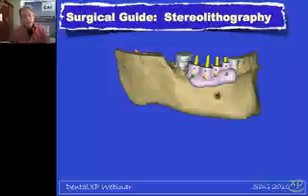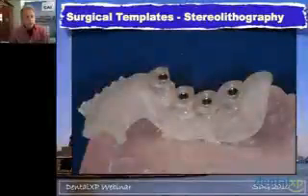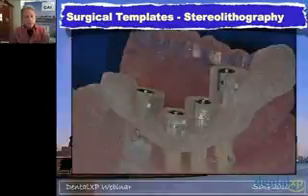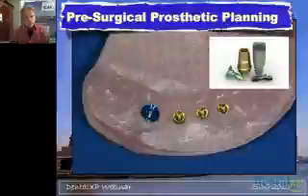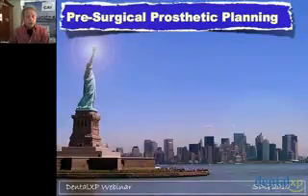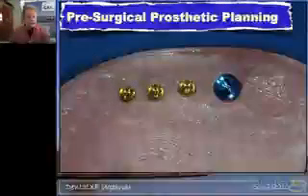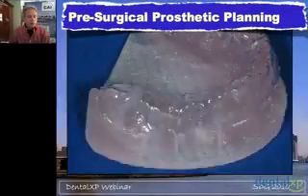And so having this capability allows us to then port out this information and get a surgical guide. Utilizing the surgical guide, creating, in this case, through stereolithography, we're going to do something that I pioneered many years ago, which is the application of model-based surgery. Model-based surgery allows us to utilize a stereolithographic model to place implant replicas within that model of the true bone position for the patient. And having that capability allows us to understand, again, implant to implant distances and plan for the correct position so that the implants will emerge within the body of the tooth.